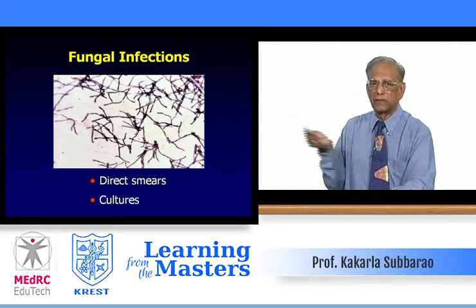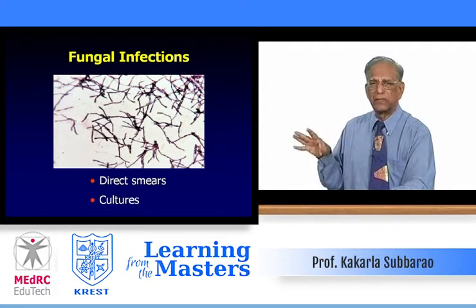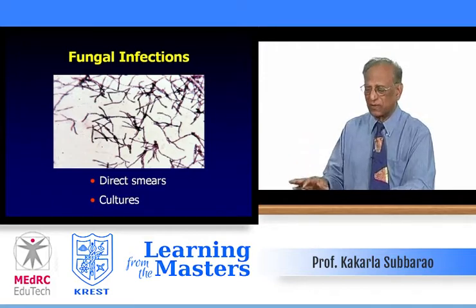Fungal infections, directly you can take a smear or culture. This is what I was telling. These mycelia are branching, looking like a fungus. But these are actinomycosis bacteria, Israeli type.